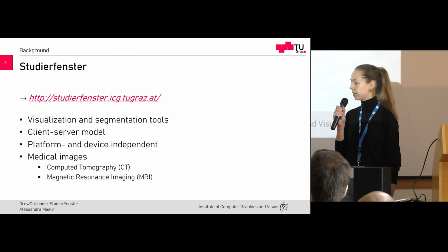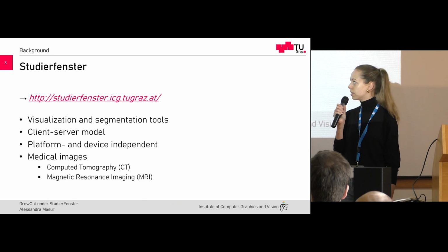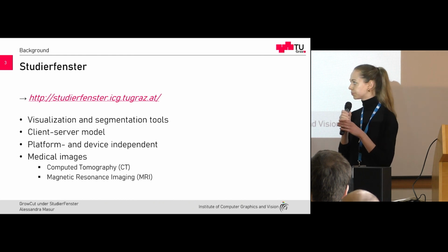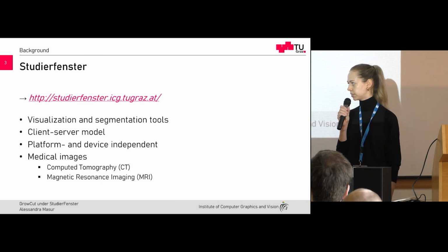It is a web-based medical image viewer that contains visualization and segmentation tools. It is based as a client-server model. It is platform and device independent because it is web-based. And the medical images that are used for the GrowCut in the StudierFenster are CT and MRI scans.